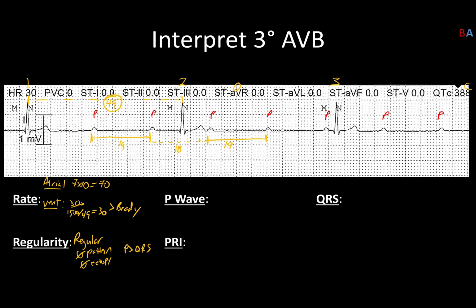And just by doing this, if you take a moment and realize that we're actually missing a P wave. From that first P wave that I marked, if you actually go back 19 spots, that is going to place you right about, let's see, this would be 5, 10, 15, 19. Right here is where there should be a missing P wave.